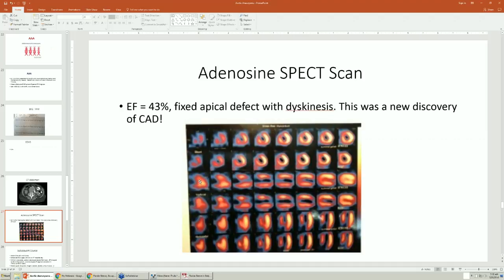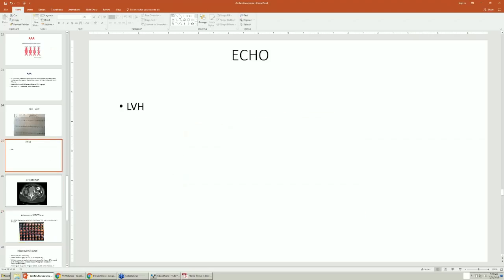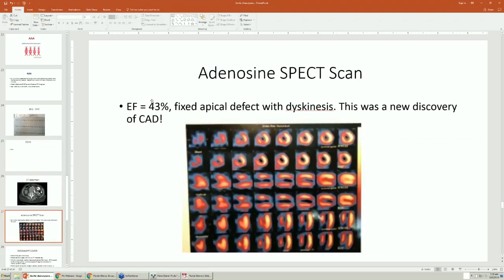that he did not know he had. And 40% of heart attacks, according to the Framingham study, are not diagnosed at the time of the heart attack. You might have a little heartburn or something. So he took off the apex sometime in his life, but it looks pretty stable by a SPECT scan, which you and I know is worthless, and we could have figured this out. A better detailed look at his echo at the apex could have figured that out. So missed it on the echo, should have been seen, and we'll see how much help this was later on.